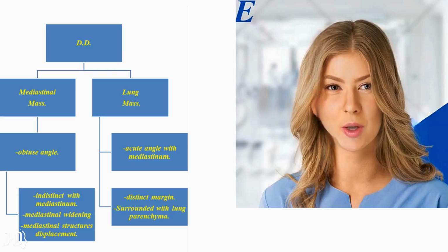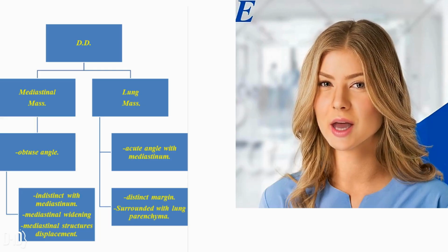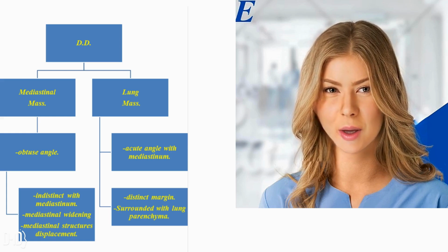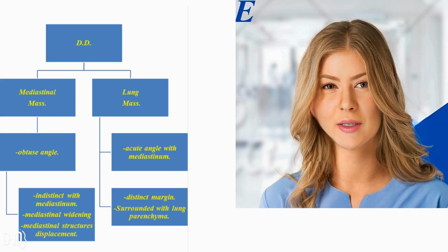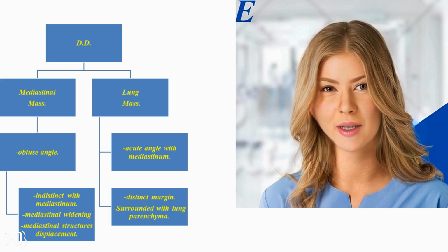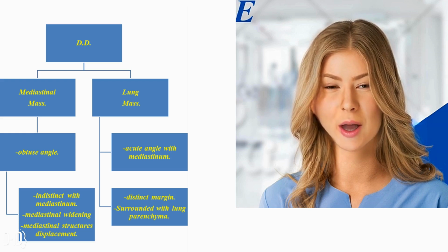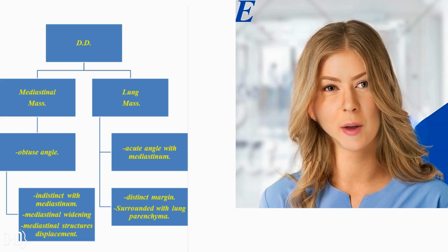Hi colleagues, with you in this lecture Dr. Rima. My talk today is about the differential diagnosis between mediastinal masses and lung masses. In case of mediastinal mass, the angle between the mass and pleura is obtuse with indistinct borders with mediastinum. In addition, there will be mediastinal widening and mediastinal structures displacement. While in case of lung mass, the angle between it and pleura is in the form of acute angle with distinct margins surrounded with lung parenchyma.